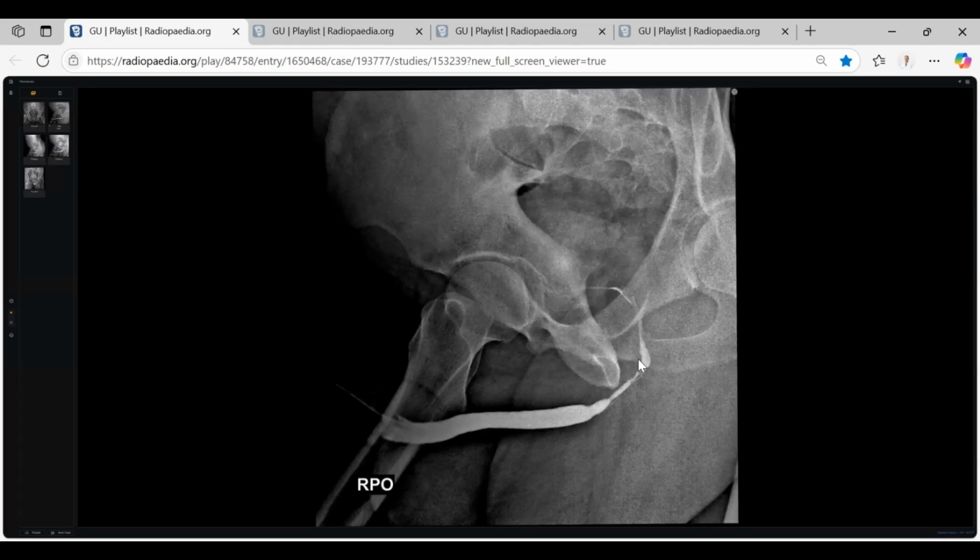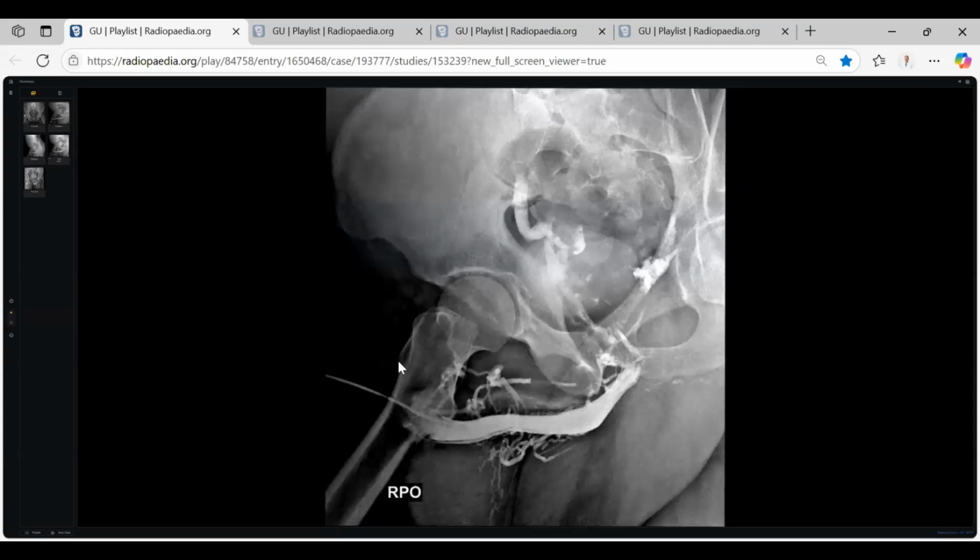No, the membranous is much more posterior. See, the structure starts from here till here. So all this part, what is the name of this part? Bulbar urethra. See, my colleagues, this is the prostatic urethra, and till here, the lower part of the bone of the pelvis, you can consider this the membranous urethra. From here, posterior, this is normal. So this intermediate segment from the bone till here is the bulbar urethra. The operator applied a lot of pressure when he was injecting the contrast, so the contrast went intravenous. So this is intravasation of the contrast.